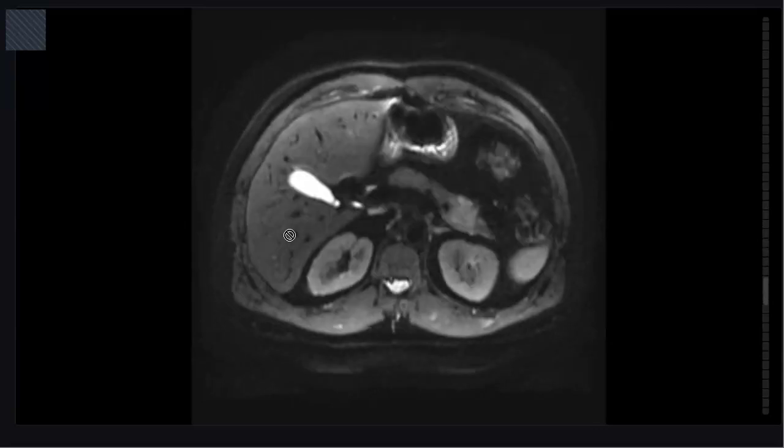So what's your final diagnosis? The lesion is showing a characteristic appearance of a cystic lesion in the different images of the MRI study. The first possibility here is mucinous cystadenoma, because it is a well defined, likely solitary, unilocular lesion, with no evidence of large septations. I didn't detect any calcification in the CT scan, and no evidence of duct dilatation as well.